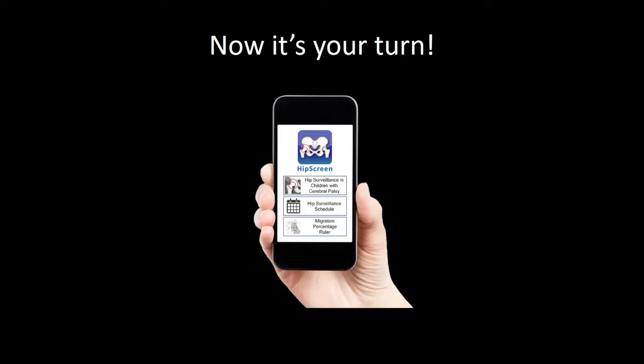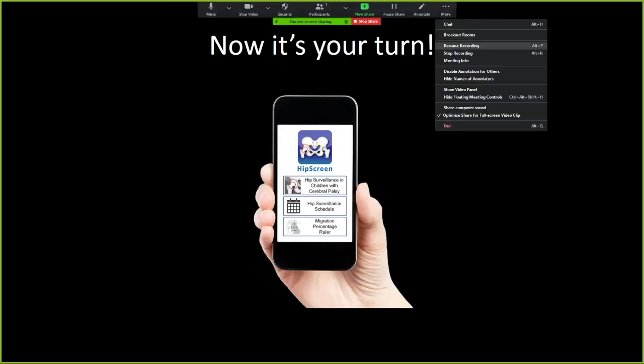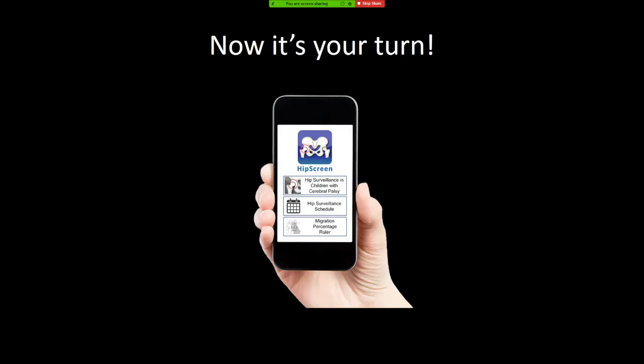So we'll try to liberate ourselves from some of that discussion and focus more on the tool. Let's go through the X-rays now.